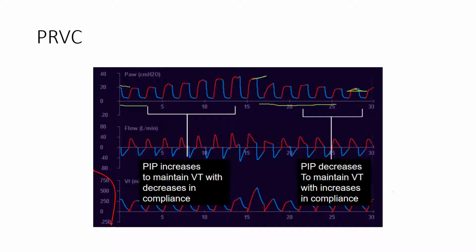Interesting, if you look at your flow waveforms and you compare this one here, you see inspiration starts and pretty much ends right on the baseline, and you don't see excessive time here, but compare that to this little guy here. Here the inspiration starts at baseline, and then inspiration is continuing.